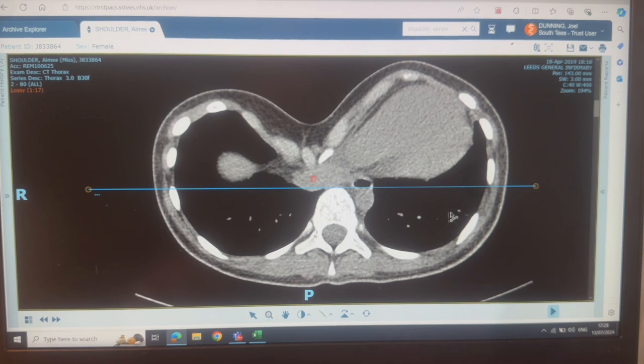My next one is, what is the widest point? I won't put these in the table again. I'm just going to do it as an example of what I do. Keep that nice and straight. If these all start to overlap and get really annoying, I sometimes just move them up out of the way. It's possible to do that. Next one, I'm going to do the bone on this side to the bone on that side, bone to bone.